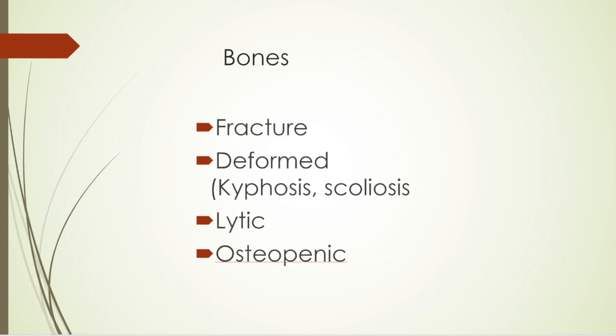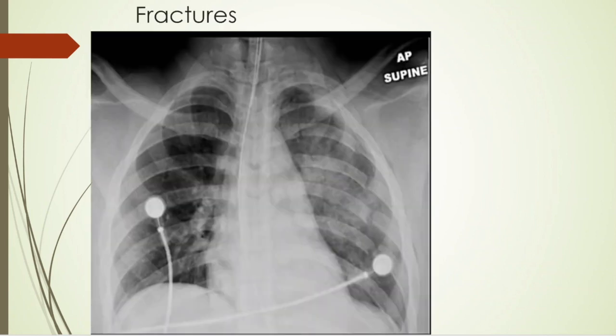But again, if I saw one, I would still wait for the radiologist to come back before I ever open my mouth to say anything about it. But it's still part of reading it, and when you look at the bones, you should be looking at that. Fractures, you should be looking at all the bones and picking out the fractures.